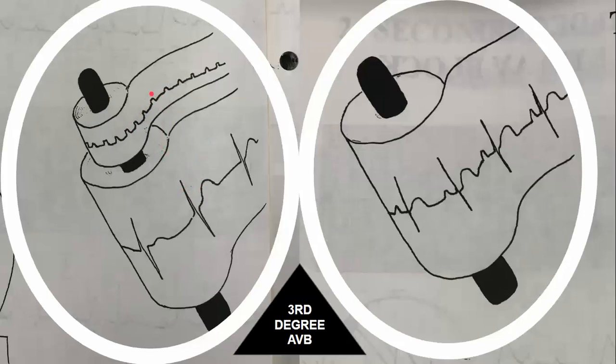And I'll leave that up to you to decide how fast you need to pull the paper toilet paper. So just for the fun of it, I made this, but it just goes to show the P waves can be just clipping along at their rate, ventricles clipping along at their rate, but the final EKG pattern puts them all on the same piece of paper, but it doesn't necessarily mean they're all beating at the same rate, okay? And that's what this is supposed to illustrate, okay? Hope you found that helpful.